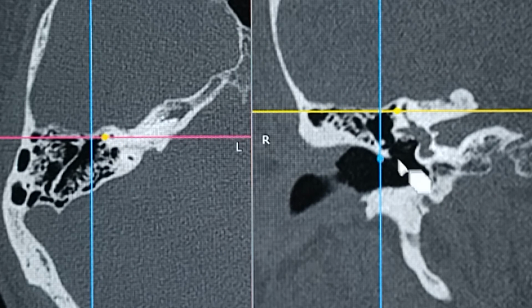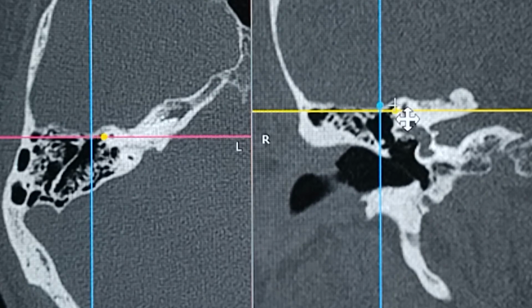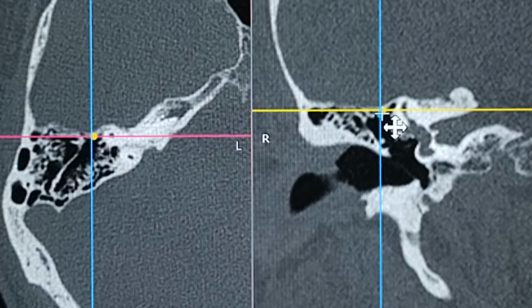Now you can see that's the mesotympanum, that's the epitympanum, and that's the tegmen tympani plate right there. If you breach this, you're gonna have a meningoencephalocele. So this is basically, now when do we call it a low-lying dura?